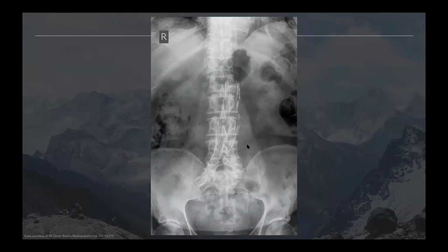And the idea is that you exclude the aneurysm sac, which then thromboses off, clots, and this is put in by interventional radiologists. So this is probably the way that most aneurysms are now managed. Open surgery used to be common, but the outcomes are pretty much identical. And a lot of people who have AAAs aren't suitable for open surgery, but are suitable for EVAR because all it requires is a groin puncture.